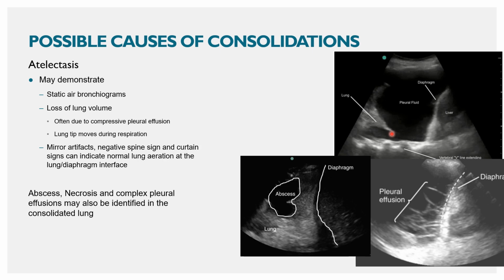Now, if you have a mirror artifact, and we talked about this in the first series where we did the physics of our point-of-care ultrasound, that is based off of the properties of how ultrasound transmits through our body. One of the things it does normally, especially near the diaphragm, around a large specular reflector, where there's a nice smooth surface interface, is that sound can come in, interact with, say, some diaphragmatic tissue, get scattered, then hit the diaphragm, and be sent back up to the transducer.